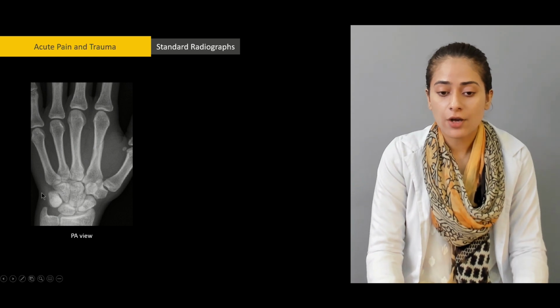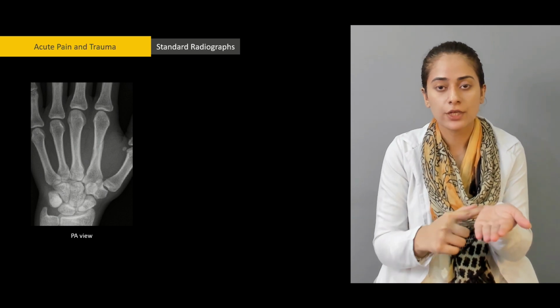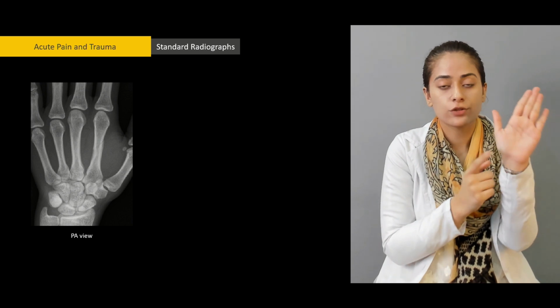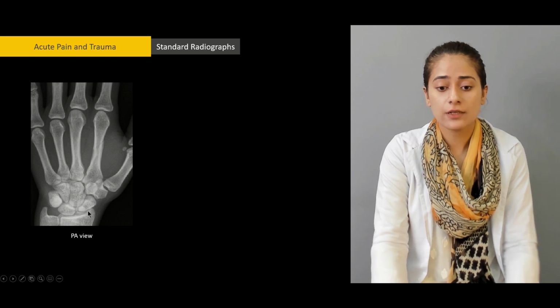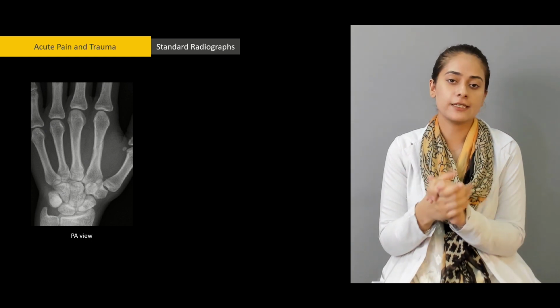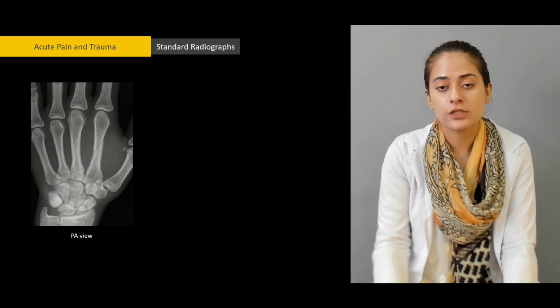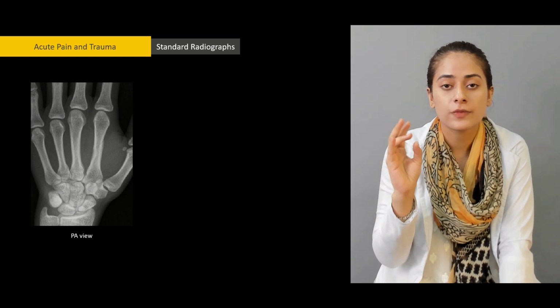So these are the carpal bones. When we're naming carpal bones, we move from lateral to medial, starting with the bone next to the radius and the thumb. So this is the lateral one, and the first is the scaphoid. Then we use the mnemonic "She looks too pretty, try to catch her." There are a lot of other ones as well, some cheeky ones out there, but this is the most widely accepted. So that's scaphoid, lunate, triquetrum, and then we have pisiform.